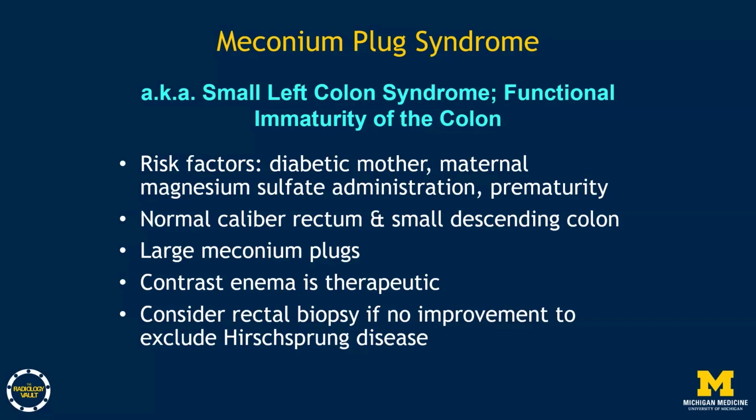Like other obstructions, there can be meconium plugs. That's where it also gets its name. And the contrast enema, like meconium ileus, can be or should be therapeutic. In other words, the patient will have an evacuation after the procedure and the bowel obstruction will improve. Now, if you do the contrast enema and you think it's small left colon syndrome, but the patient shows no improvement, it is often recommended that you should do a suction rectal biopsy to make sure that you're not missing Hirschsprung disease. That is in the differential.